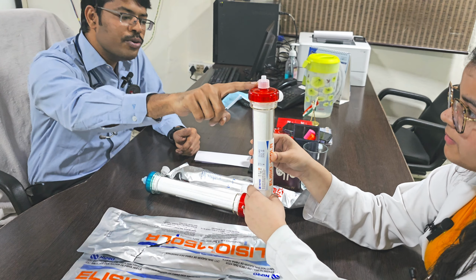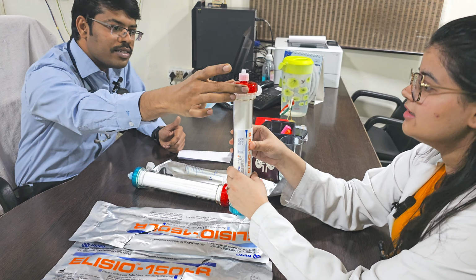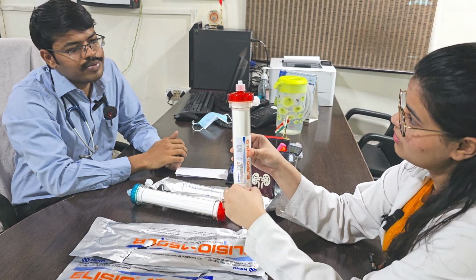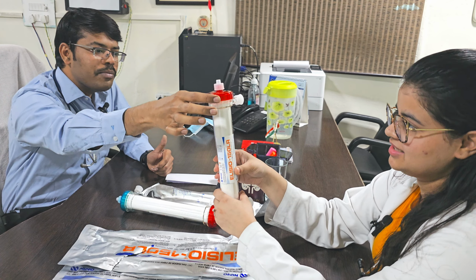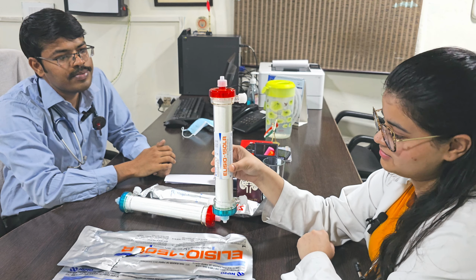O-ring. Yes. And what do you call this? Header space. Headers. Yes. Header. And this material, what will you say? Hollow tube. This is the potting material. Housing material. Housing you can see. Potting material actually holds it. Housing material holds the entire dialyzer.